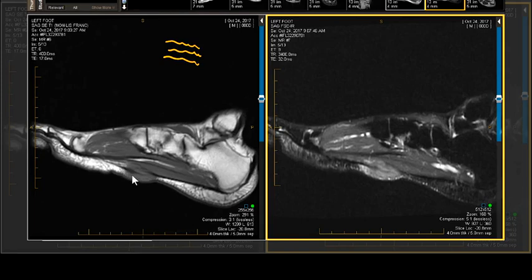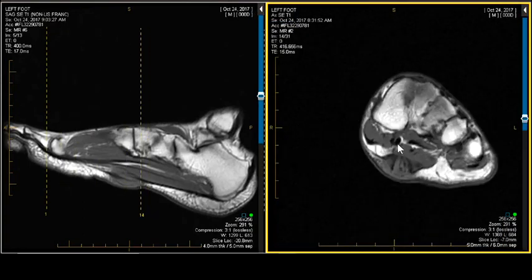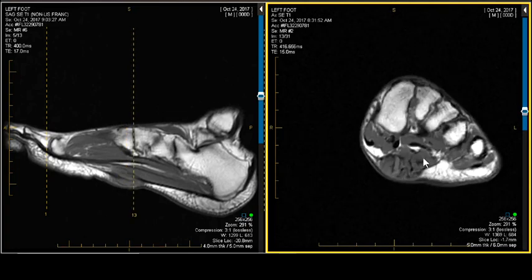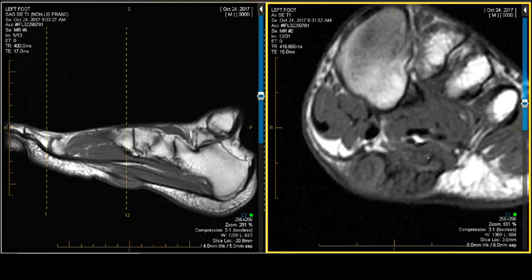These occur in the same place almost every time, right at the base of the metatarsals, in the central cord of the plantar fascia. This is a big one, although we've seen them a heck of a lot bigger. Look at that kind of corduroy look. Let me blow it up for you. That parallel kind of spaghetti look. That's very typical of this entity and related entities.